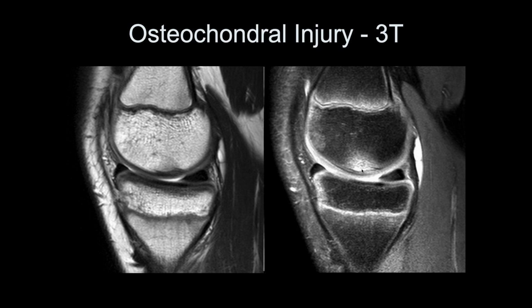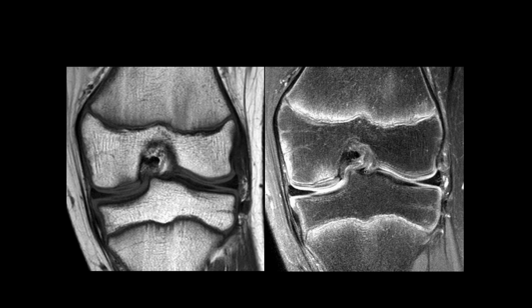On the lateral side, on the first two, the proximal tibial physis, you see a fine line on a fat sat image over here, right there, and then on the T1 on the left side, you see a dark line. Yes. I wonder if that's an injury. It could be, but I see that a lot, these little kind of lines here. And I think these are more vascular rather than trauma. Okay.